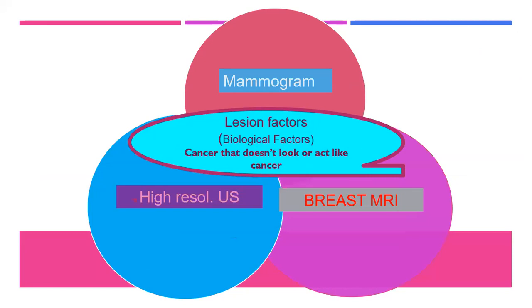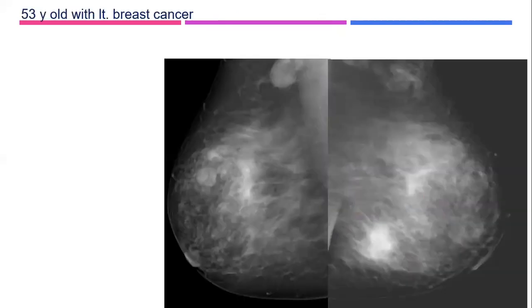So we went through the lesion factors, and let us see the observer factors. What about this mammogram? This is my second missed cancer case in my experience.